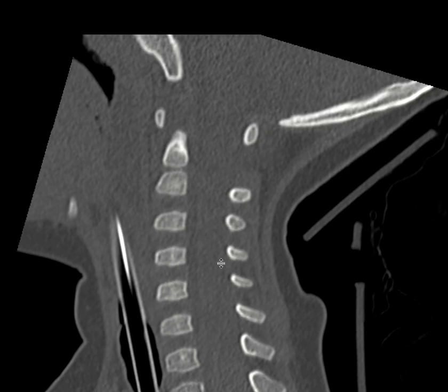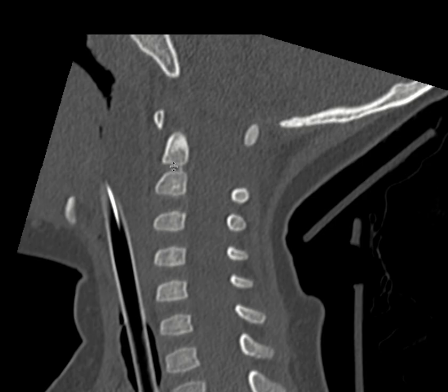As we see, this is a small kid. These endplates of the vertebral bodies are not ossified completely. This is a C2 vertebral body, as you see, and it's not completely fused, as we expected at this age. Now, when we are talking about craniocervical dissociation, we have to do some measurements.